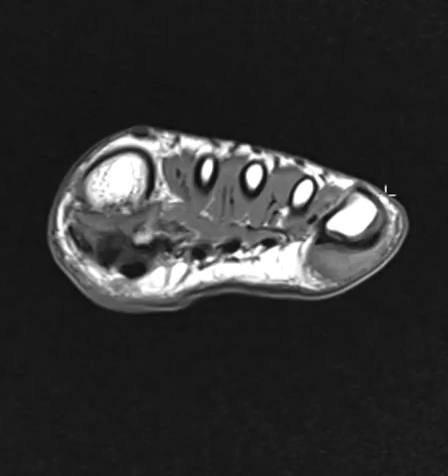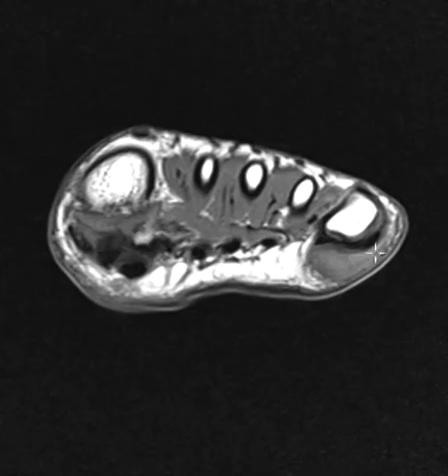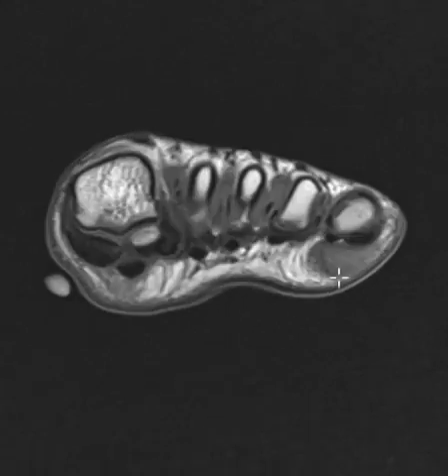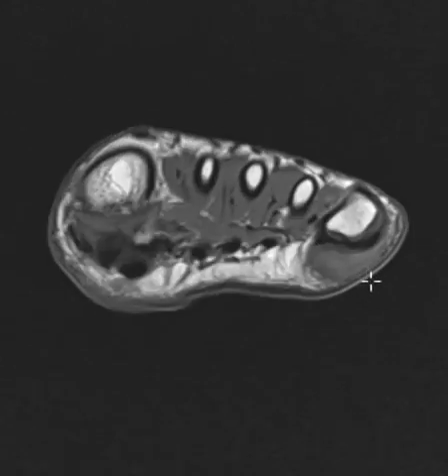This is an incidental finding along the lateral part. This is the fifth metatarsal head. Beneath that we see this big mound of intermediate signal within the subcutaneous fat. We see the bright fat through here looking normal, and you get to here and see this big mound. So this is an inflammatory response. We call this a pressure lesion.